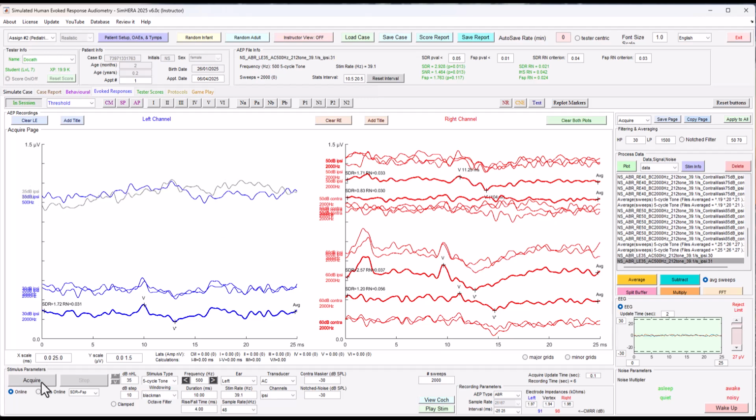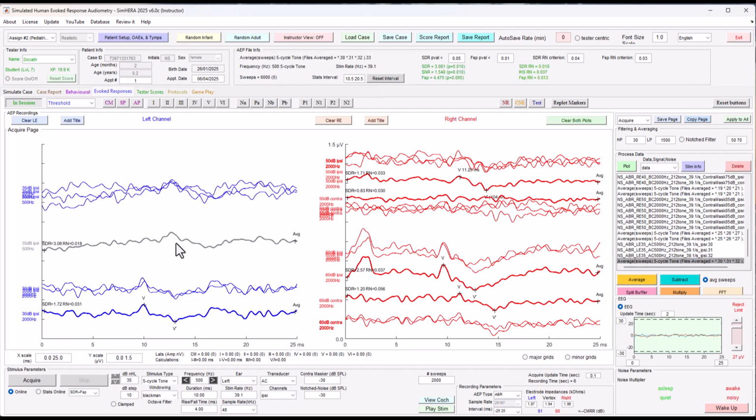There's a little bit too much noise. I'm going to do one more replication just to be sure. There's a little bit too much going on there. That could just be a hump due to noise, but now I'm seeing it in definitely those 2 as well as a third. So that is a nice replication of a wave 5.